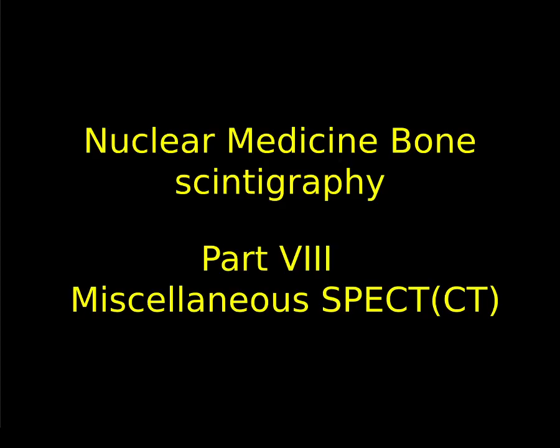Hello, and welcome to the final part of this nuclear medicine bone scintigraphy series. So today we're just going to talk about a few miscellaneous examples of SPECT CT which haven't really fit in anywhere else.